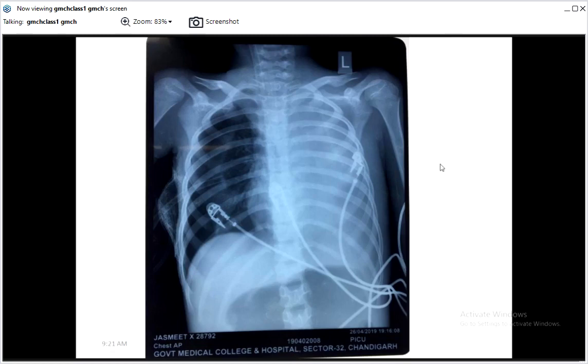So here you can see the pathology on both the sides. This side is completely radio opaque, and this area is radiolucent. You cannot see any whitish areas or bronchovascular markings in this area. There is a chest tube in situ. This sulcus is deep. There is a deep sulcus sign. Okay, the right costophrenic angle is deep.